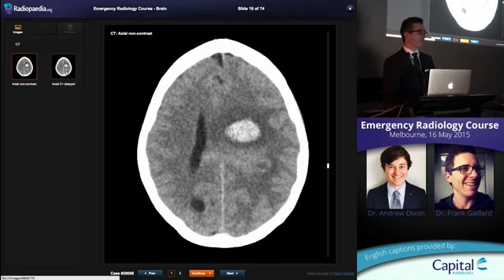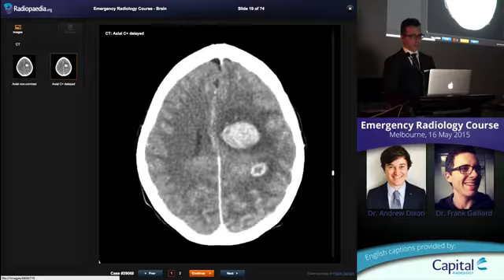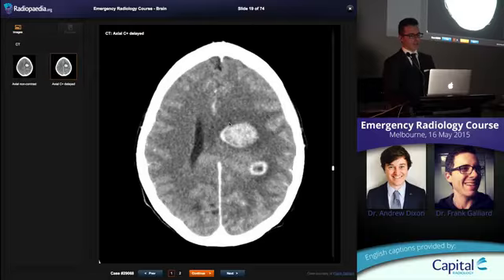Contrast is your friend. The brain receives a lot of blood, so it will change its appearance with contrast. Give contrast, and now you see that next to this lesion is a peripherally enhancing lesion with more not particularly enhancing tumour extending across the corpus callosum. So this is hemorrhage within a glioblastoma, or GBM. Not terribly commonly do they bleed so macroscopically. A small amount of blood is really common. But again, you need to be aware that there's an underlying lesion. Treatment will be very different.